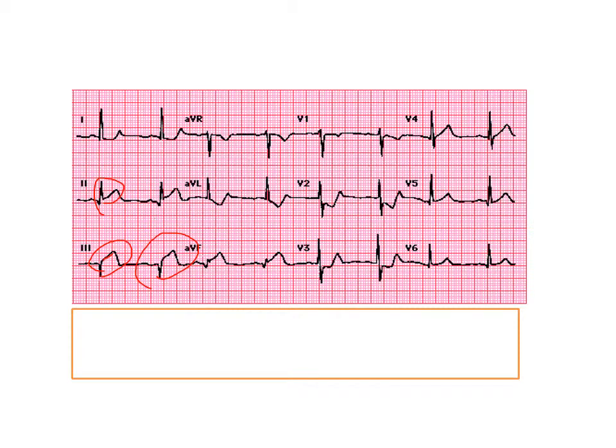It's kind of flat, and it's elevated above that PR interval, so from that baseline. So you've got some ST elevation. It's in 2 as well, 3 and AVF. So you've got ST elevation in the inferior leads, 2, 3, and AVF, meaning you've got to have an inferior infarct. The inferior leads usually correspond to the right coronary artery, FYI, but you've got an inferior infarct.